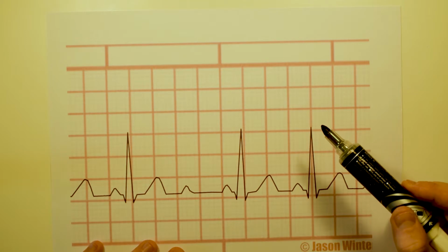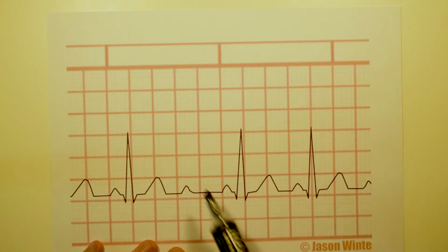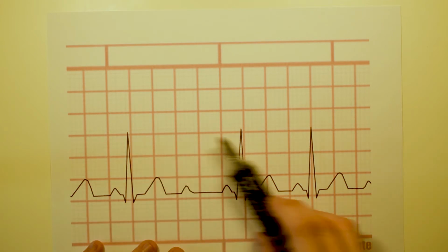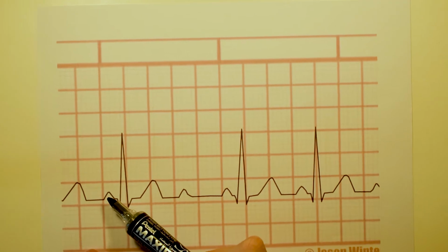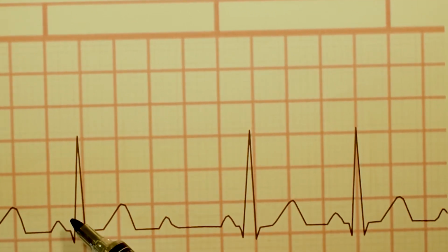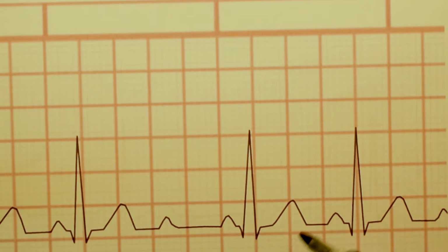So now we're going to look at, does it look normal? Do we see anything that's missing? I can see just straight off that there's something missing here because this is broader or bigger than that. All right. Do we have a P wave before every QRS? Do we have a QRS after every P? That's P, QRS, T, P, and then there's nothing here. P, QRS, T, P, QRS, T. Cool. So all I see is a gap here.